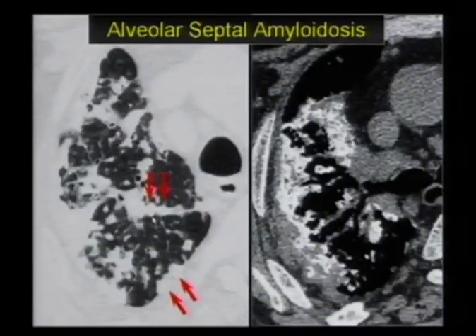This is a long interlobular septum, a series of septa kind of strung together. You can see a little septum right here, a little septum right there. These nodules are sitting right on the septa, so it's characteristic of a perilymphatic process. And in this case, they're calcified, and areas of conglomeration of the amyloid will give you areas of calcification as well.